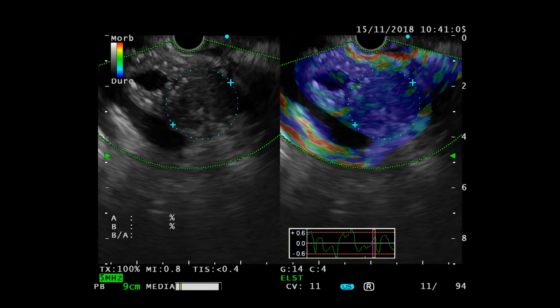I wouldn't expect that much from contrast and elasto in this case because we have a lot of artifacts due to calcifications and the arrangement of the parenchyma. It's true only for autoimmune pancreatitis that you can get some results with contrast, but classic chronic pancreatitis I would expect to be hypoenhanced and not get any significant advantage. The same for elasto.